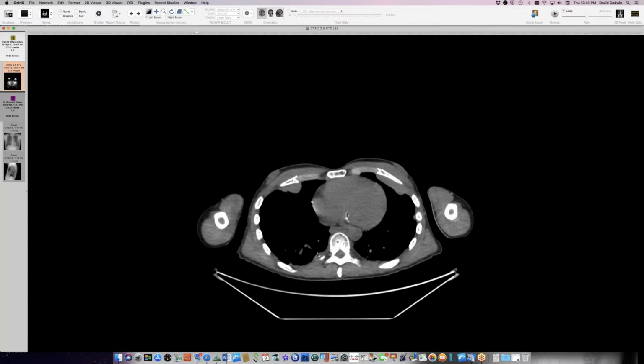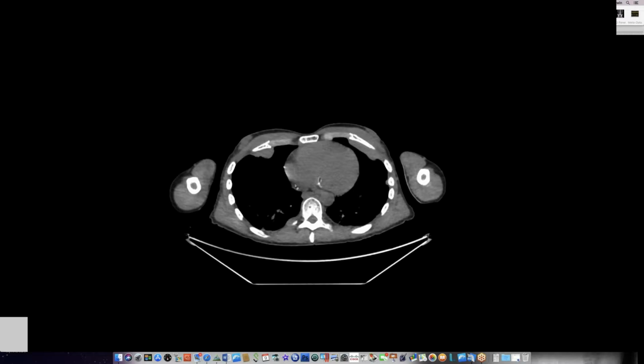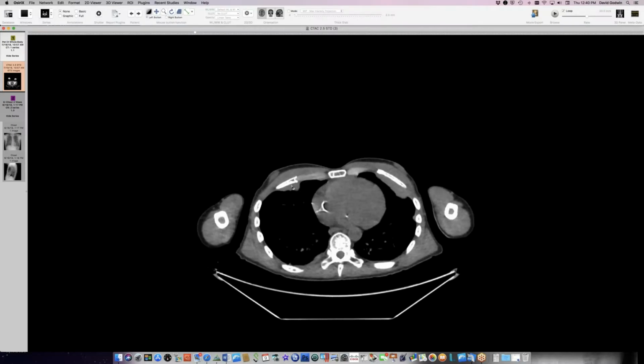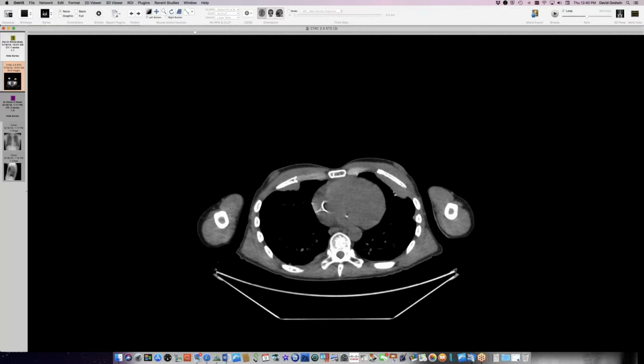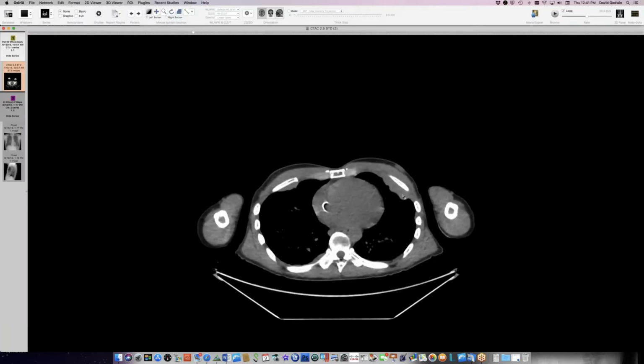This person has myeloma in bones, but also has these huge extraosseous components, and they're not clearly associated with destroyed bone. So the bone's not destroyed here. It doesn't look like, for instance, metastatic renal cancer with bone destruction and then tumor surrounding the bone. It's probably leaked out of these bones, but not with really broken cortex, maybe porous cortex or something. But we have all this extraosseous myeloma. This is a dramatic case, just in terms of the bulkiness of it.